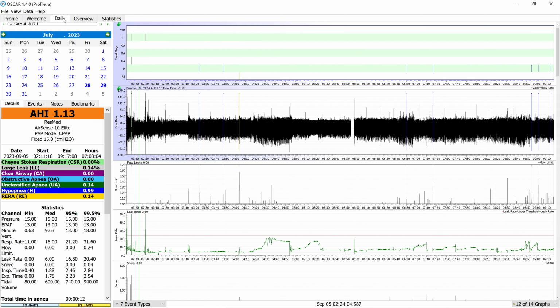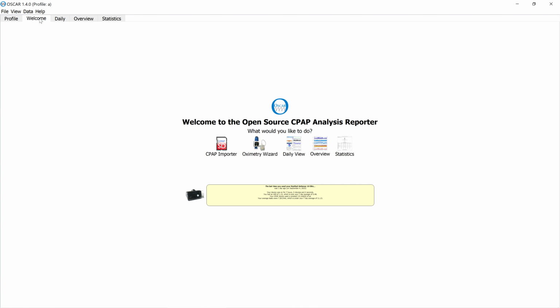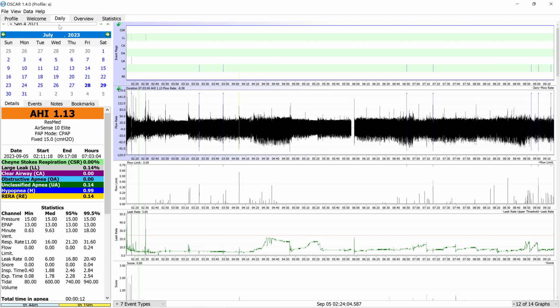But so you guys were introduced to the profile tab. Welcome is just the front page. And the daily tab. There's still the overview and statistics. We'll go over that in later videos. And of course, there's the entire menu, which we didn't go into at all. But this should at least get you up and running.